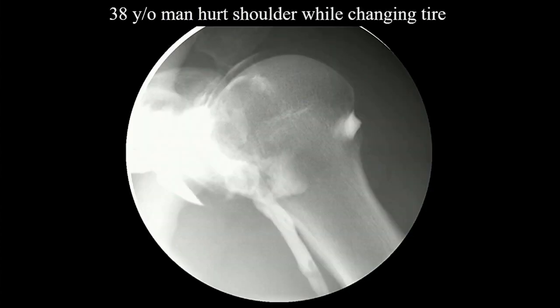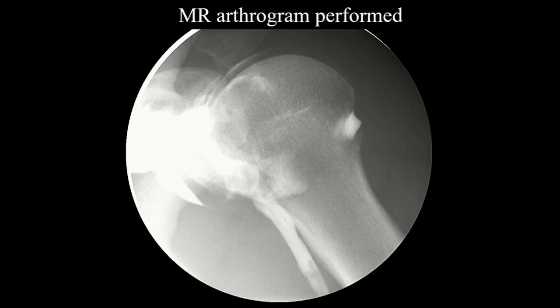Okay, next patient. This is a 38-year-old man, and he felt a sudden sensation and pain while he was changing a tire. So this is an arthrogram that we do typically these days prior to MR or to CT. We really don't do many arthrograms and stop these days. But if you look at this, try to think about, is there anything abnormal that's striking you? And if you don't do many of these, it's going to be difficult. Or if you have done these many decades ago, this is all we had.